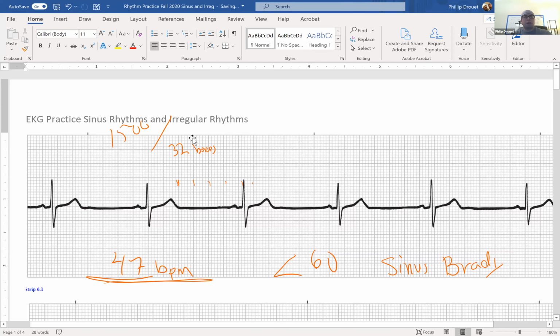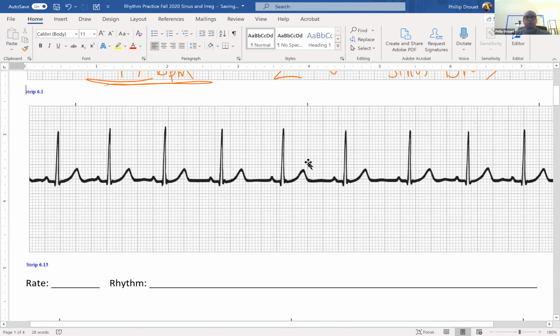And this next one is going to be a little bit faster as we go through it. All right, so we'll check for regularity. Step number 1. We'll slide across in hopes that everything is nice and normal. Okay, that one is now short. So now we're short by 2 boxes. 2 boxes. 3 boxes. 3 boxes. 4 boxes. 2 boxes.